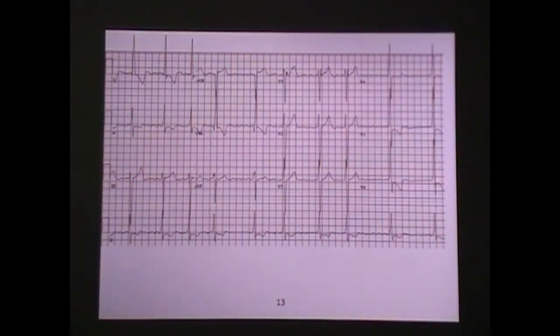What else? Looking at my QT interval, it's less than half, so I don't care at that point. But I start looking at this and I'm like, oh hey, look how tall that is. That's a big boy. Let's go see. I've got big old S waves down here, and a big QRS complex getting progressively bigger in V4 through V6. And look, right there I've got a strain pattern.